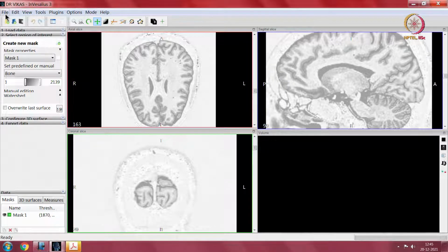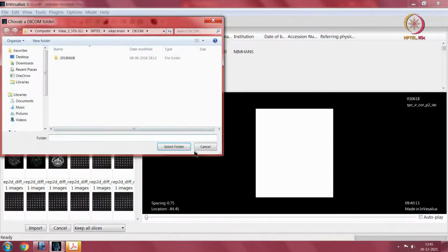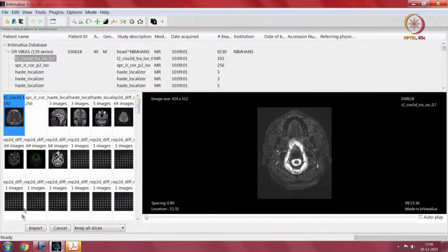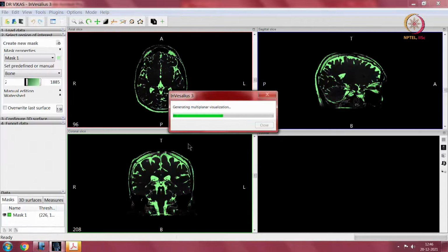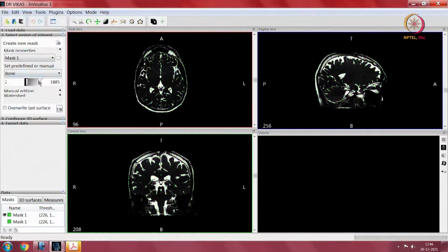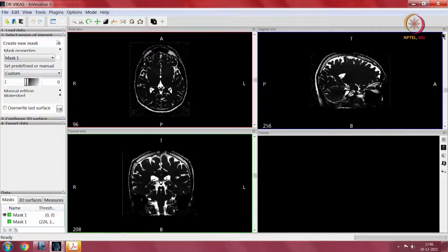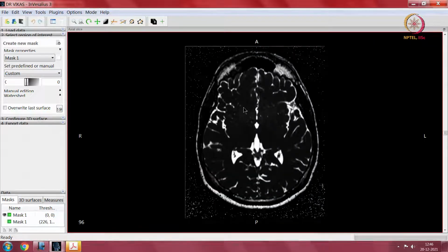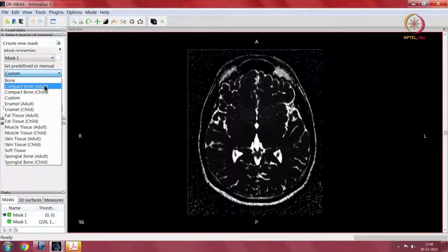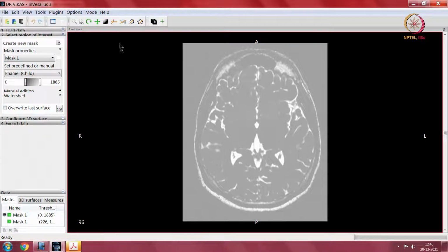I will be showing you the, so, this is something called a CISS image. CISS image, again it is a gray scale image.